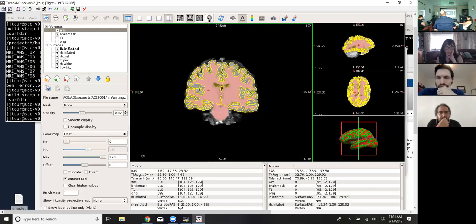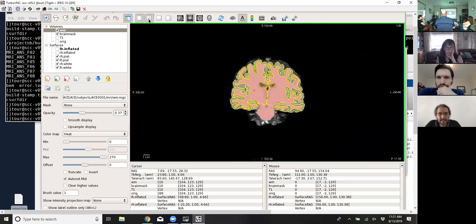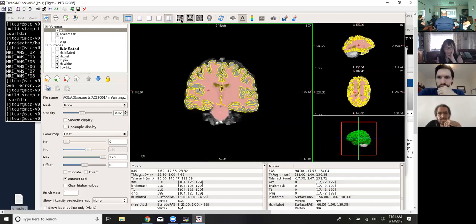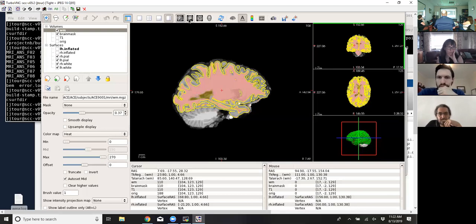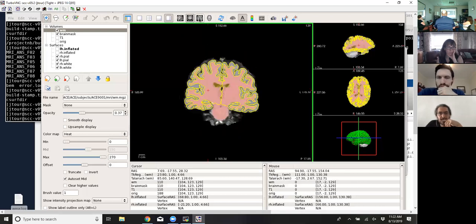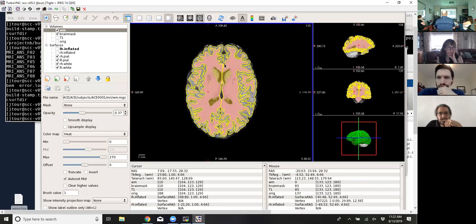Up until maybe this version of FreeView or the one before, what it was bad about doing was, let's say I'm going to uncheck these. Just to go back to tutorialness, you can change what this window of images looks like, and you can change which image shows up in this main window. You have sagittal, axial, or coronal, and you can click here.